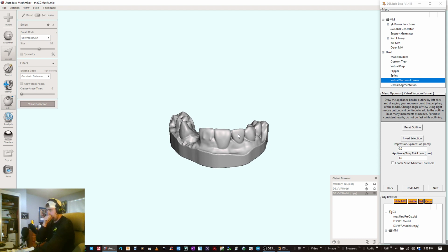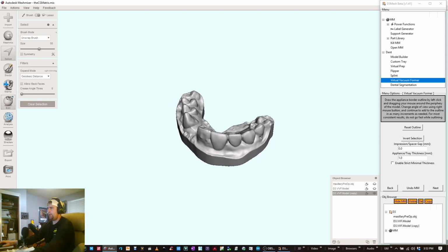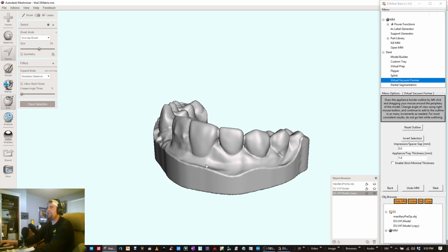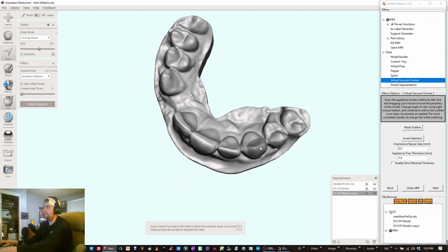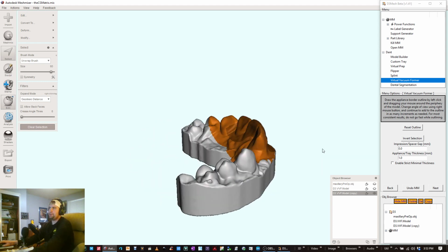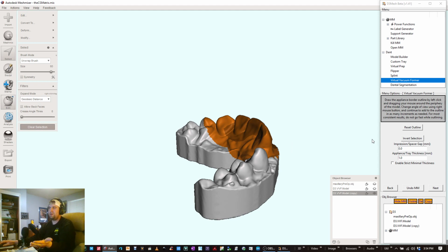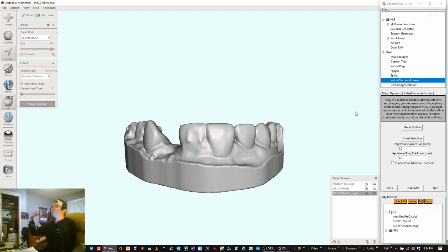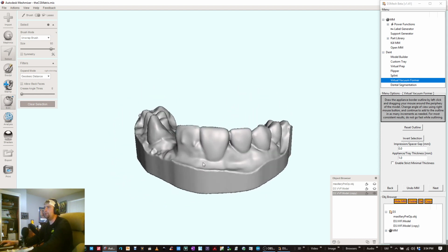But if you start to think about it, if you want this matrix that is going to fit over the teeth to stay on and to be accurate and to not bump loose when you're curing or rinsing or moving things around, it probably would be okay to just do this segment, right? You don't really need everything else. That will just fit directly over the portion that you're working. Maybe extend it half a tooth one way, and half a tooth or a full tooth the other way. That'd probably be the minimal thing you could do. But to get all the other teeth also included in this tray, I think it's going to really stabilize things and allow it to seat properly and to not move nearly as much. So we're going to include as much as we can.